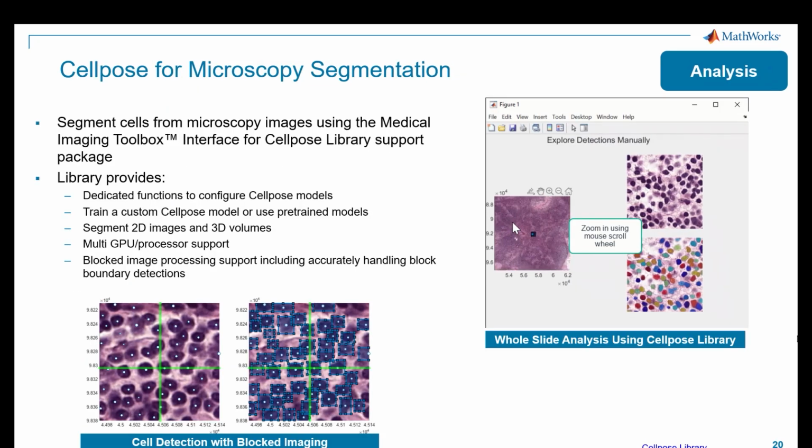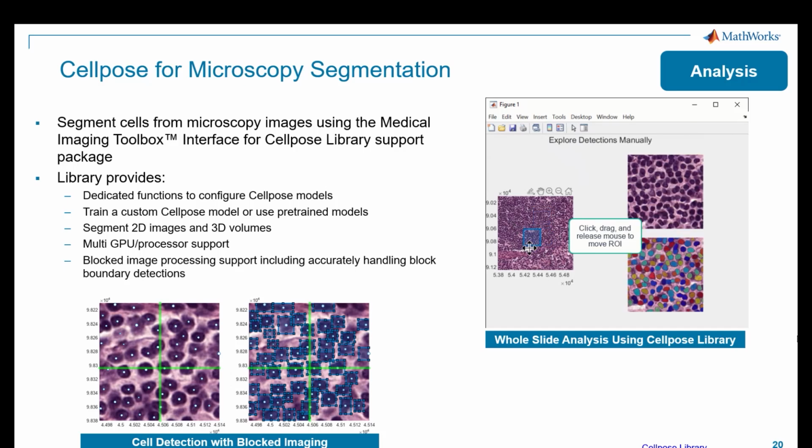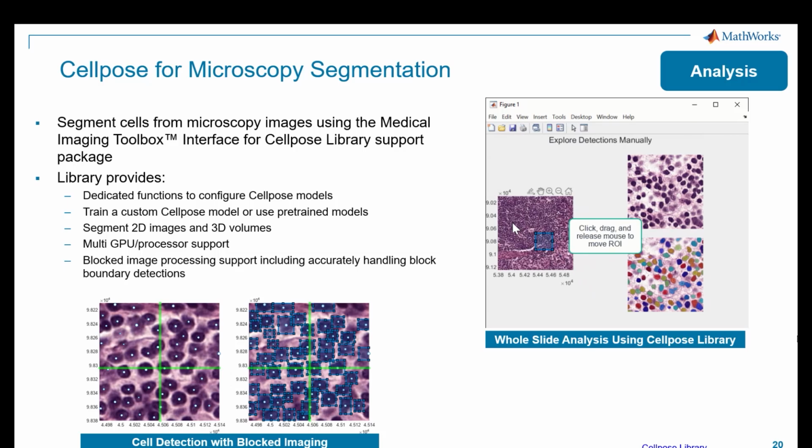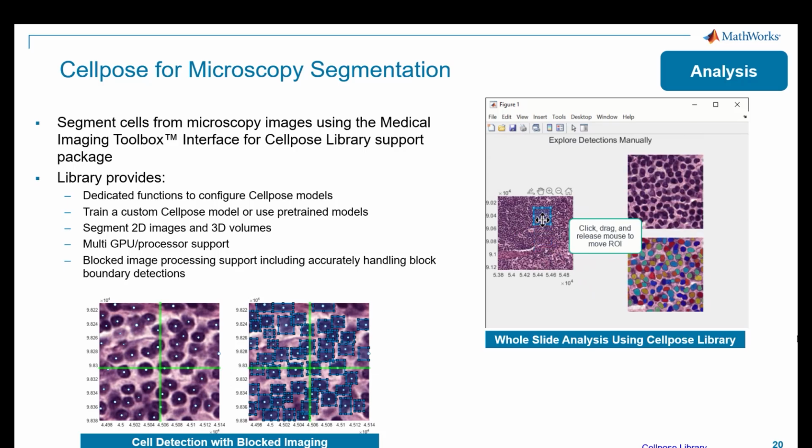Detecting and counting objects can, in general, be exceptionally difficult when objects are hard to detect or are contiguous with one another. We know that deep learning can make challenging image processing problems tractable. In fact, the Cellpose deep learning model, introduced in R2023b, can make short work of counting cells even across block boundaries.